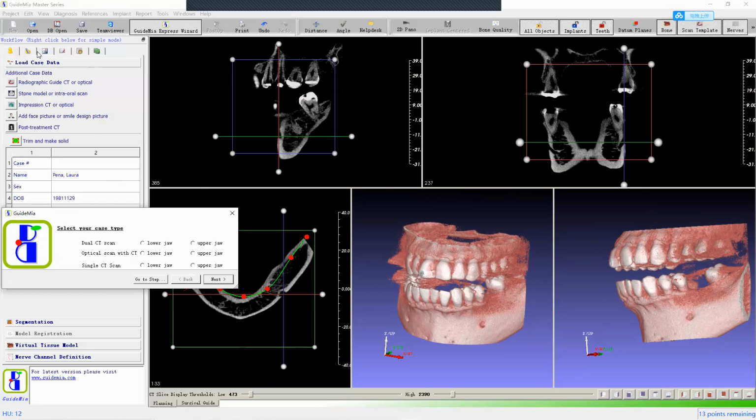In the meantime, we will explain the workflow panel here and find the corresponding functions between them. And the next time we will gradually move onto this full workflow so you can explore additional functions.